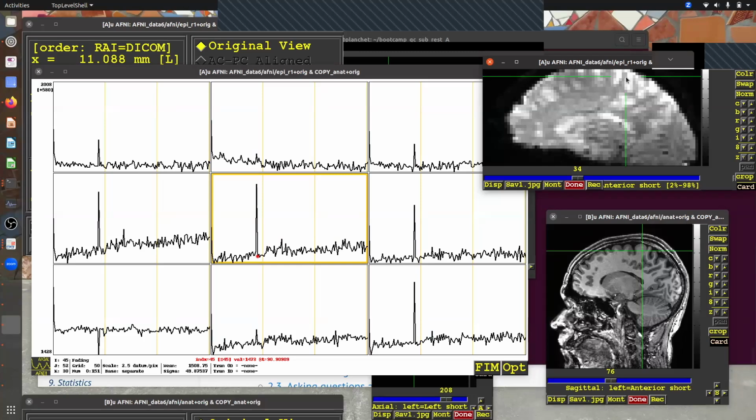And usually where we see spikes is where you've been monitoring gray matter, the subject moves, now it's white matter that's there, and maybe the brain moves back. This particular nodding motion looks fairly much like back and forth: you're measuring something, the subject moved, and they move back to where they were, so you're back on course. And that's why the spike looks fairly clean. It's bubbling along, the subject moved, and you're back where you were.